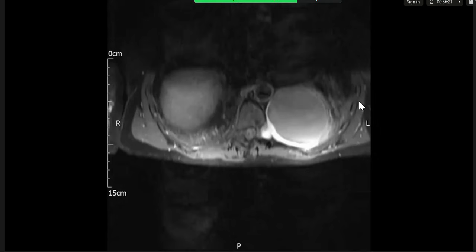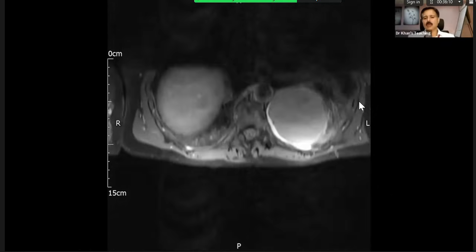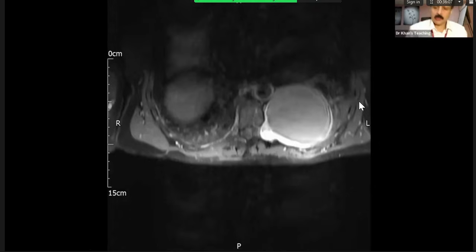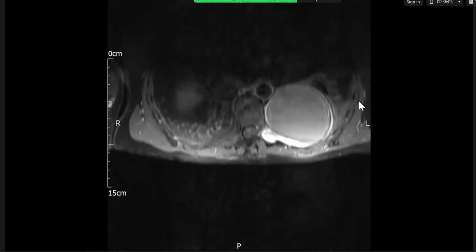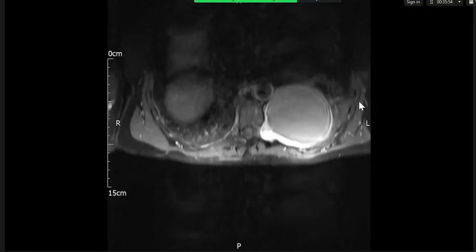This is with contrast. So this is a post contrast, and we can see vascular enhancement in various places. And the previous one, therefore, was probably a T1 pre. Yeah. So how do you explain that high signal within it? So then what that says is that the internal contents are not just pure fluid. They must be either proteinaceous fluid or mucinous fluid, or potentially the other causes of T1 intrinsic high signal, so melanin, cholesterol, etc. Okay, what is your conclusion?